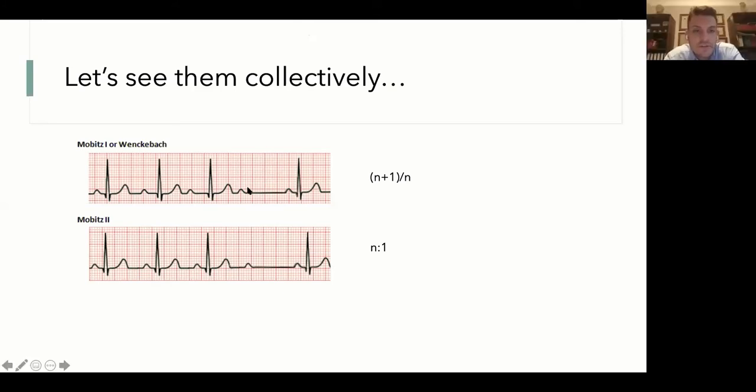And would you care to tell me how the formula would look like in this case? For this one, 4 to 3. Yeah, precisely. Correct. It is 4 to 3. Yeah, great job. I don't know who you are, but great. You got the hang of it.